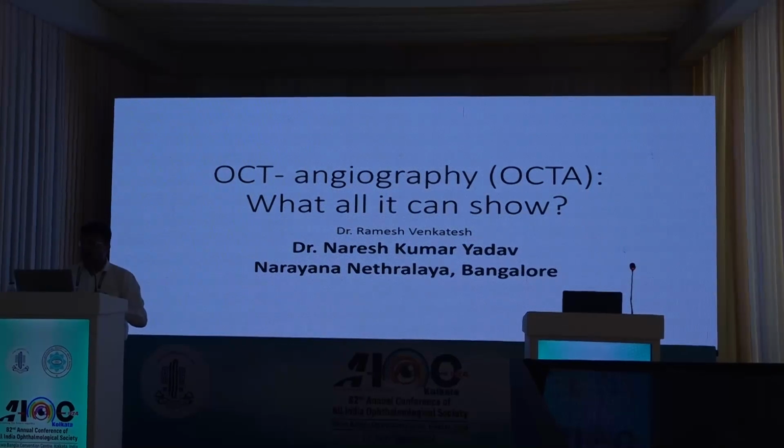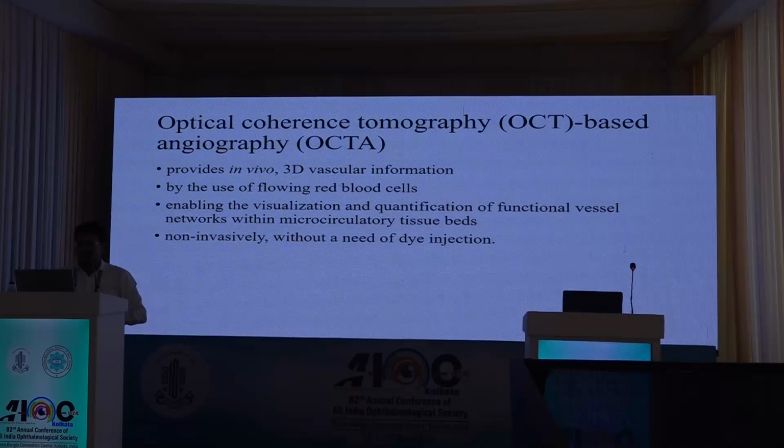Naresh Yadav, who was not able to come for this meeting. OCT angiography, it basically provides an in vivo 3D vascular information by using the flow of the red blood cells which are in the blood vessels and enabling the visualization and the quantification of the functional vascular network which are there within the microcirculatory vascular beds, and it is non-invasive in nature and it does not require a dye to be injected.